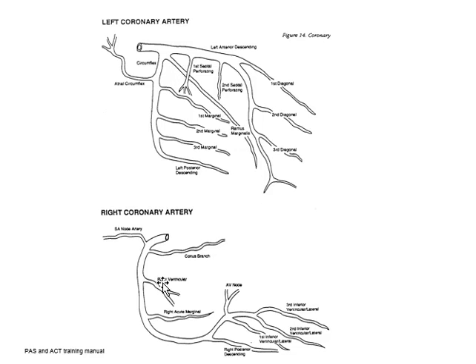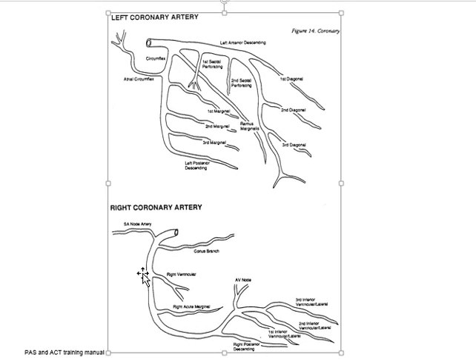The right coronary artery, as I said, is quite simple. It courses down the inferior wall of the heart, as we've already seen.